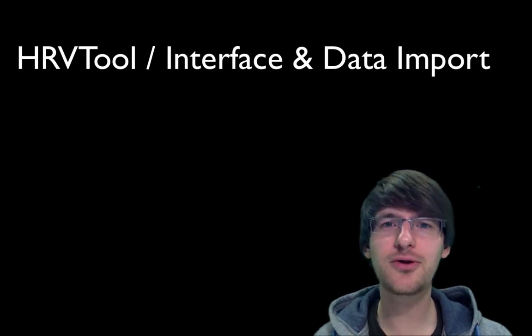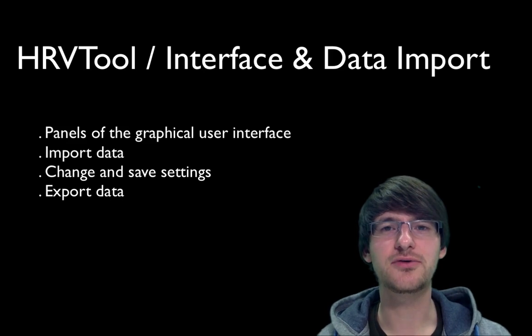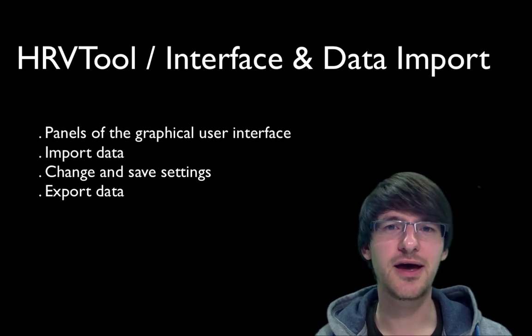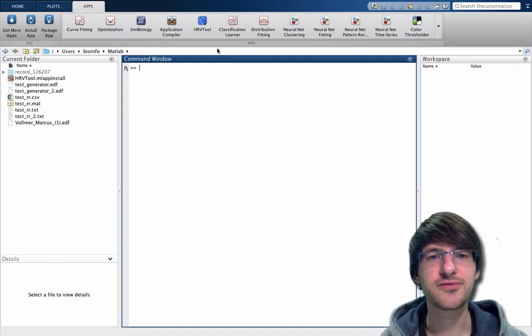So in this tutorial you will learn more about the graphical user interface, about the different panels, how to import data, how to save settings and make some adjustments, and how to export data. So let's start and open HRVTool in Matlab.